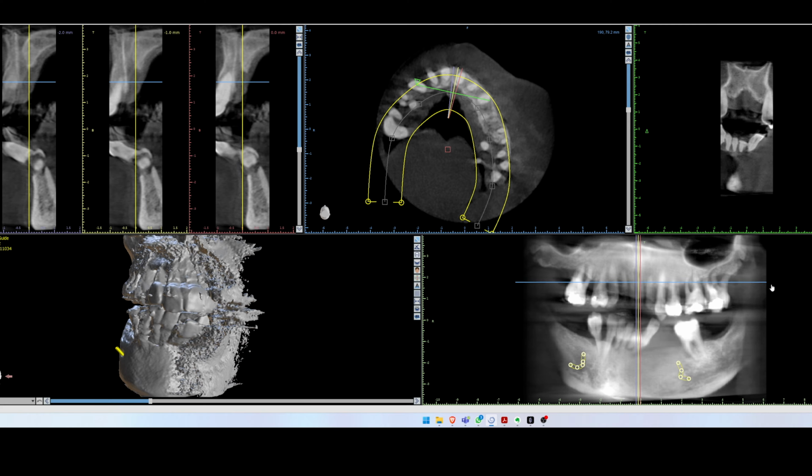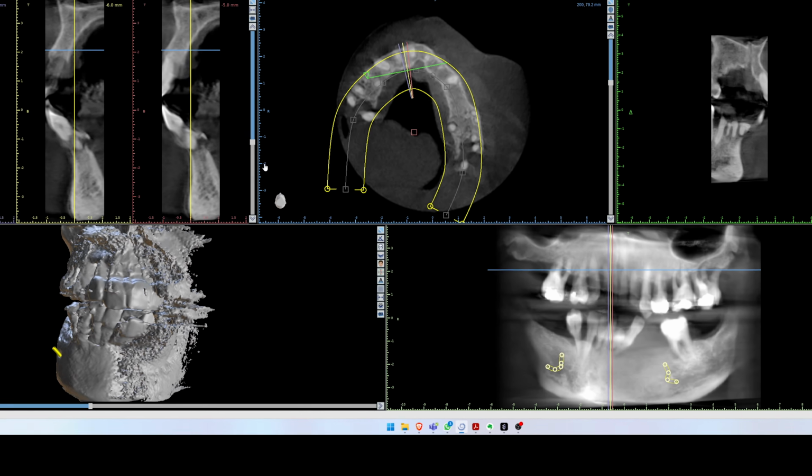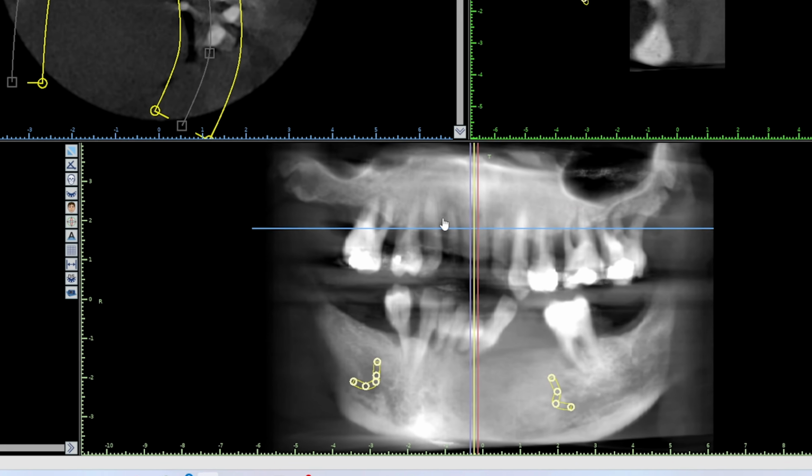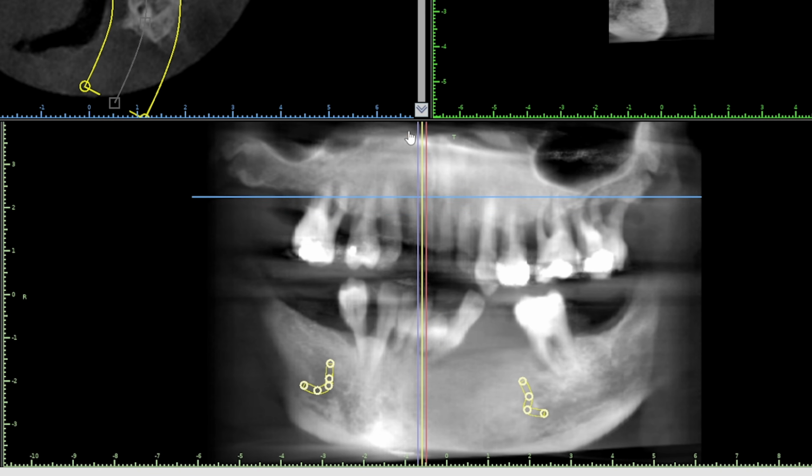And then if we were to cut in the blue, where the blue line is, you get this view up here. Okay, so we know that from our aesthetic planning, we need to take the gum higher by 6 millimeters. So what we do is we look here, and I know that there's an implant going to go roughly in that position.